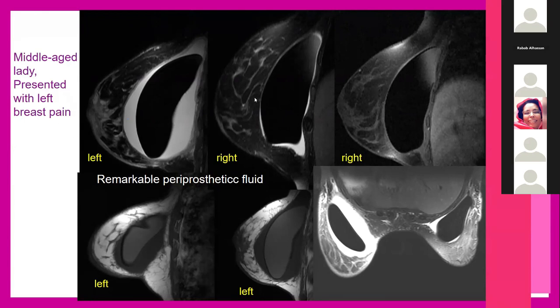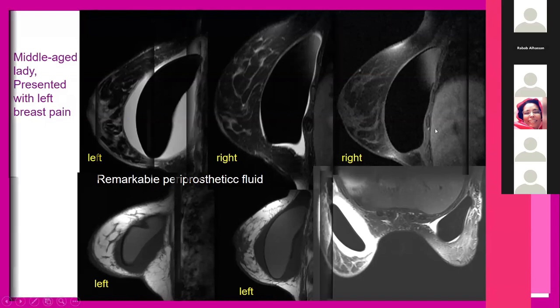And if you look at the breast itself, this is edematous. There is diffuse breast edema. Can you see it here? Can you see the amount of fluid compared with the other one? And can you see the edematous changes here, in the non-fat suppressed and even in the fat suppressed images, if you compare with the contralateral one? So I'm dealing with a large amount. And let me show you the next post-contrast study.